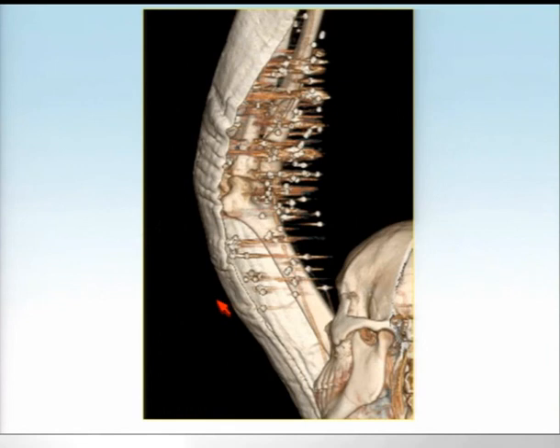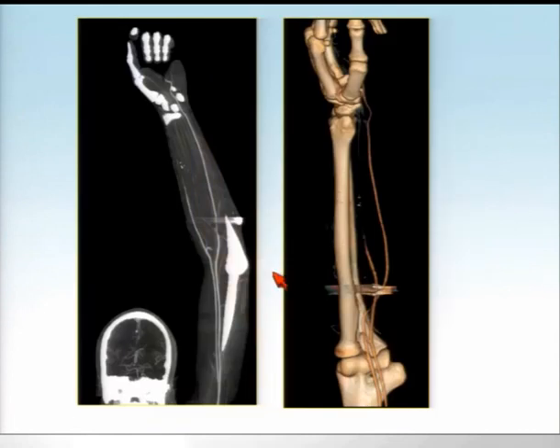And we see a non-diagnostic, basically, CT angiogram. The pretest probability of injury is so high that this patient probably deserves conventional angiography in an OR setting. Another nice example of an arm above the head. This is really optimal technique if we can do it, and we see an injury to the radial artery in this example.